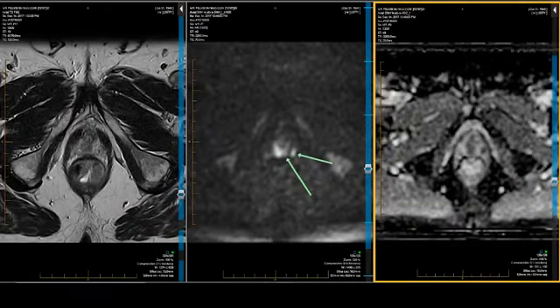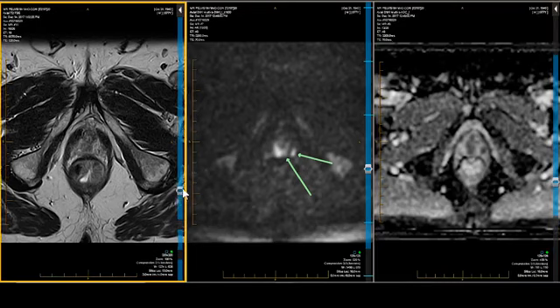Let's take a 77-year-old man with a PSA of 13.42, a negative biopsy in December of 2015, and now we're 2 years later in 2017. So he's obviously undergone MRI as part of a surveillance program with a negative biopsy. We've got axial T2, 2D fast spin echo imaging, 3mm cuts. We also have the 3D images as well, and we may show those or not.